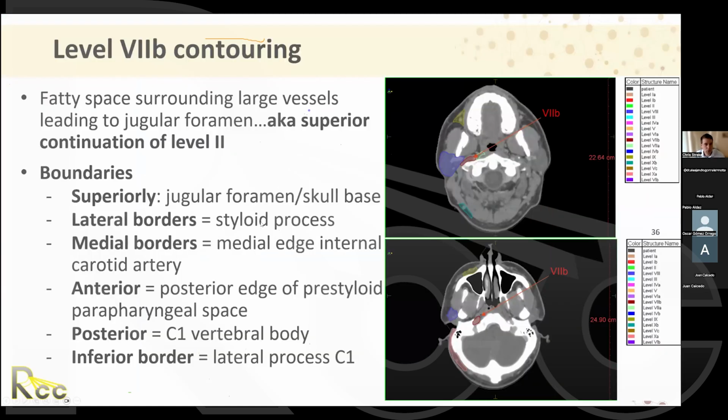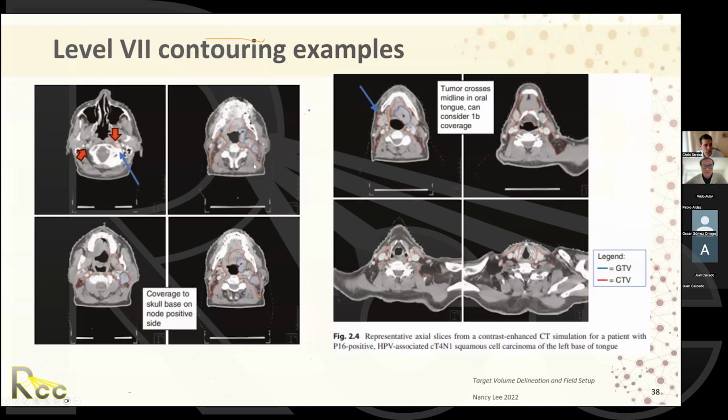Here's Portillo. Okay, so here's a couple of contouring examples. And again, I think this is a nice palate cleanser after those very, very tight, sort of formally defined nodal groups on the examples I just showed you. Again, I think they're super useful for seeing the formal definition of the regions, but this would be much more typical contouring style. So you can see that basically there's just a bit more generous, a bit smoother contouring.